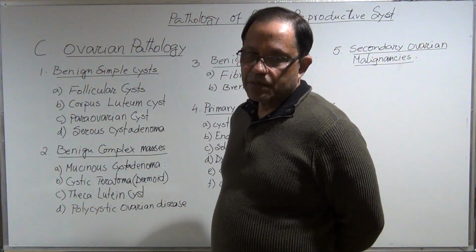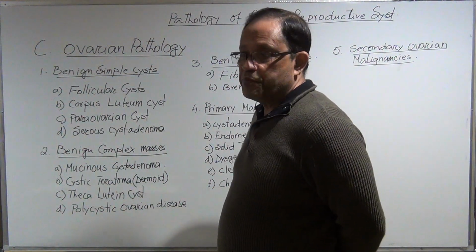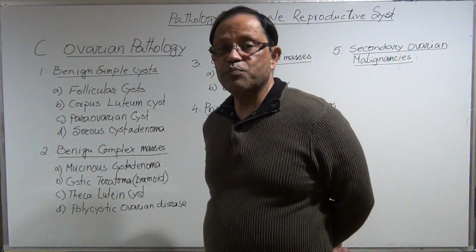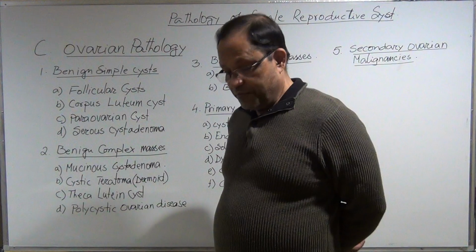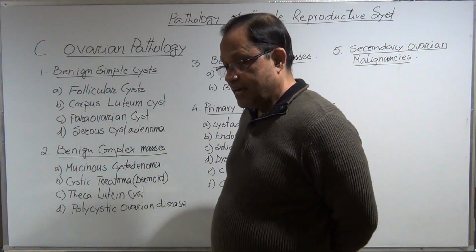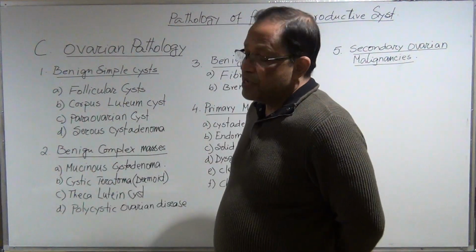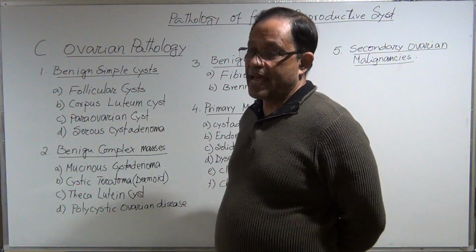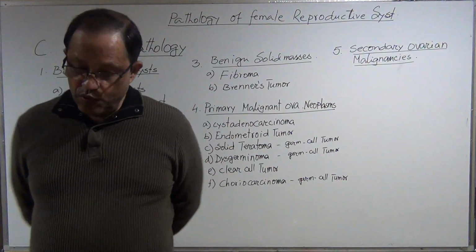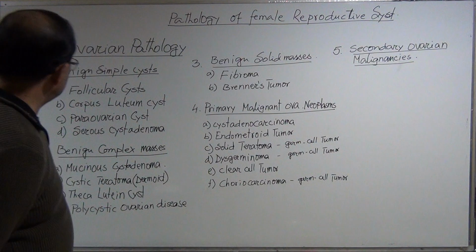It leaks or ruptures. Okay, how do I know that it ruptured? Look at the fluid amount or fluid content in the posterior cul-de-sac. If you see there's fluid in the posterior cul-de-sac, and the patient is after the ovulatory phase, in the secretory phase, then we need to understand that this fluid came from the ovulation. And this fluid is blood mixed fluid, tissue fluid like.